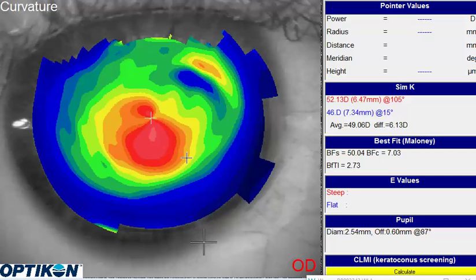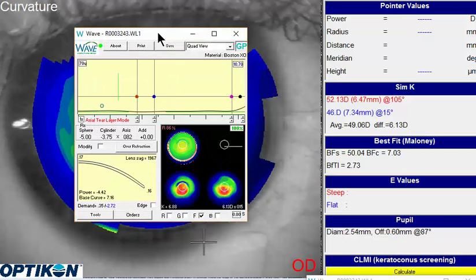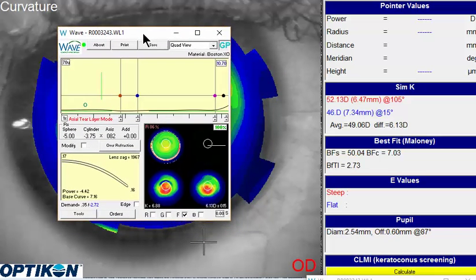With that said, let's take a look at your design. So what I pulled up here is the actual lens that you designed, and it actually looks good overall, but obviously we know it's fitting very steeply centrally. So one of the things I like to do to get a sense of how this lens is actually performing, I like to switch over here to RSIM, and what that'll do is show the representation of this lens as sort of the spherical base curve component, if you will. And that shows you that you're at a base curve equivalent of about a 7.04.